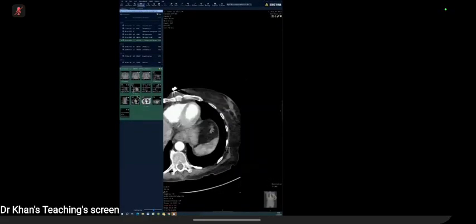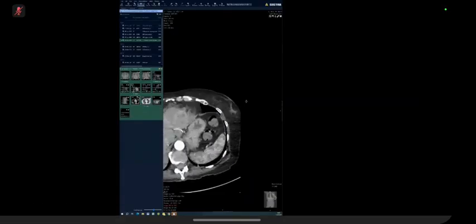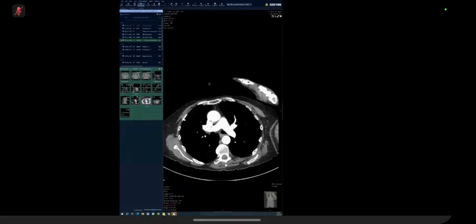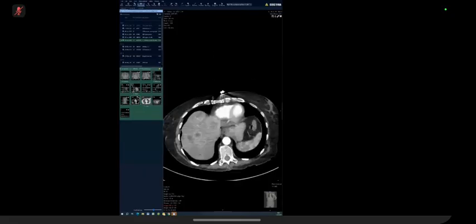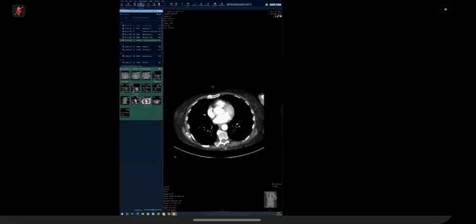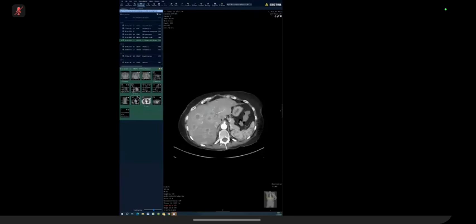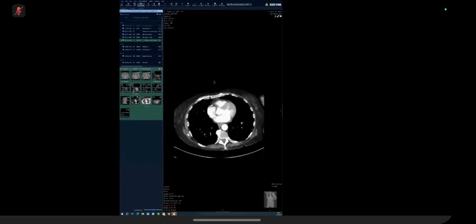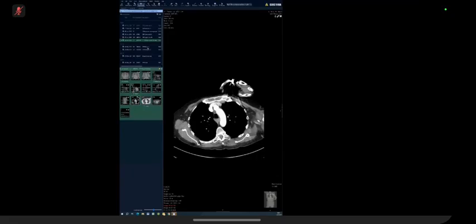Are you looking at this? I think that's nothing. It's just breast tissue. Okay, there's a right mastectomy. There's no mastectomy. I think it's just an old patient. They're a bit asymmetrical. The breast tissue is normal. We're going to go back to the bone first.